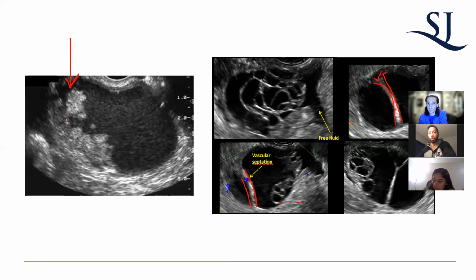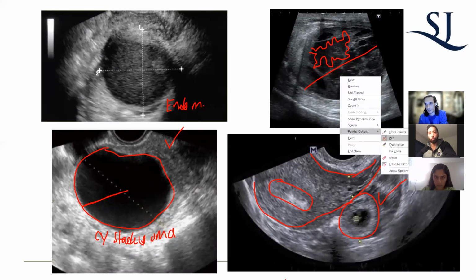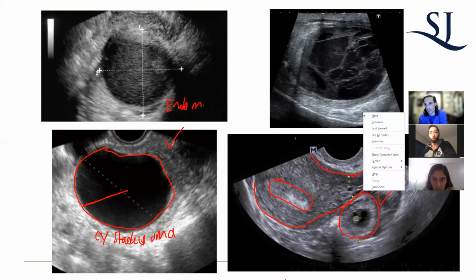But this is the worst one on the left. That's your papillary excrescence. See how it looks kind of like that jagged thing that I tried to draw? Bad news. And the contents are a little hazy. It's either blood or malignant cells in there. No good. See these septations, they're bright, they're strong. These are not. That's why you know it's a hemorrhagic cyst.